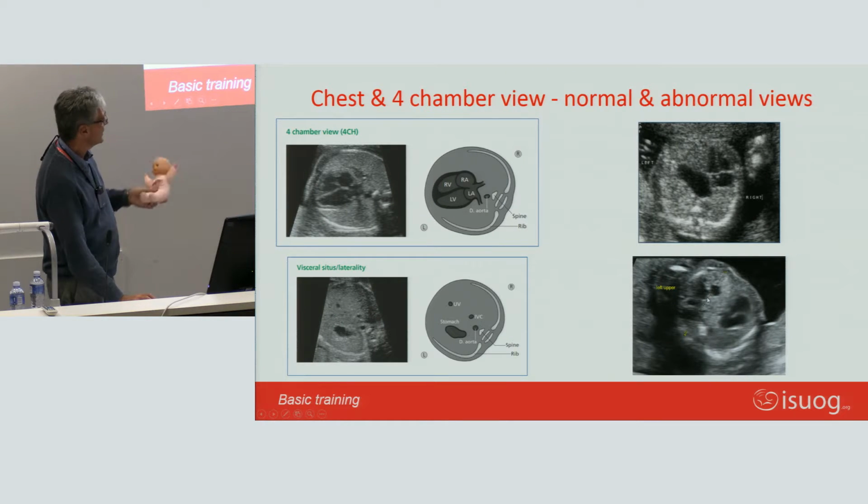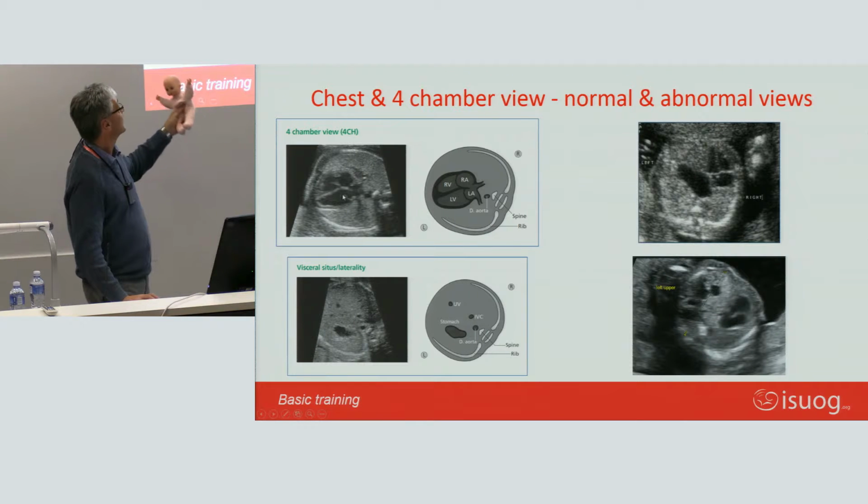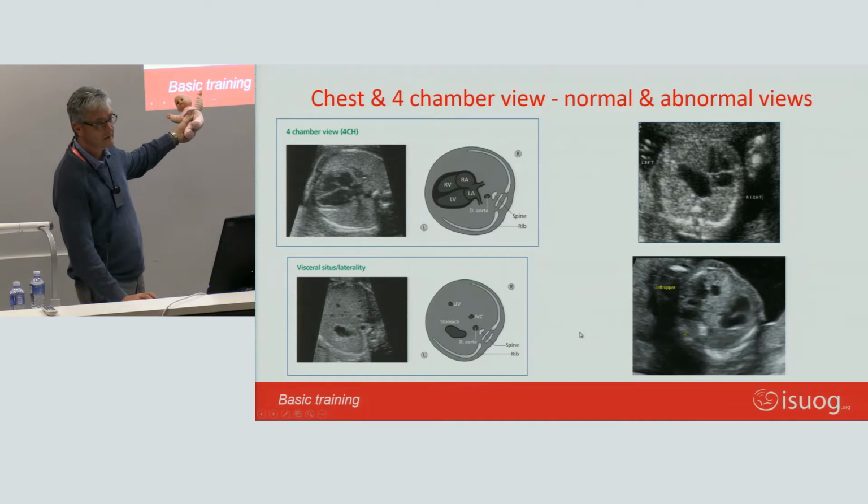And again, you don't need to worry about that. This is just someone to put on the next bus to Tygerberg or wherever you refer to sort this out. And again, I've told you, Poppy tells you, this is my left hand, so my heart's pointing to the left, the stomach is pointing to the left.